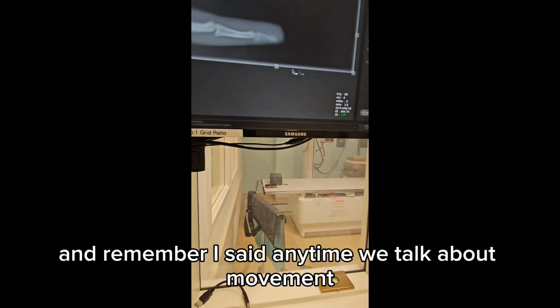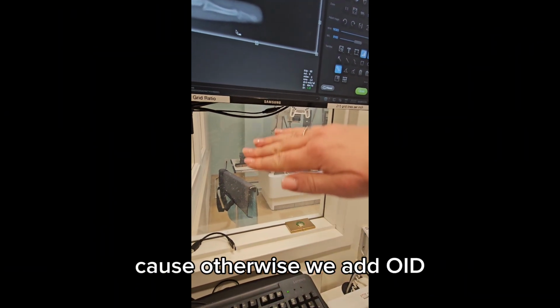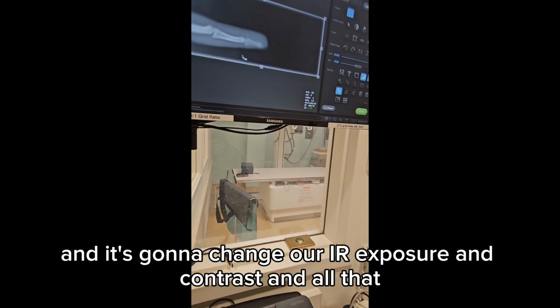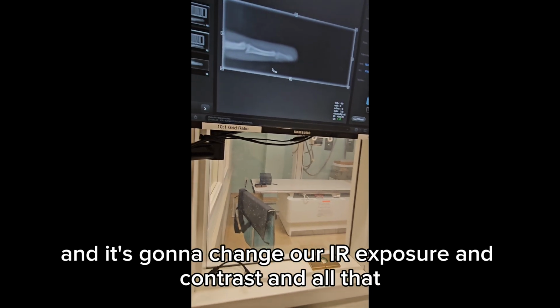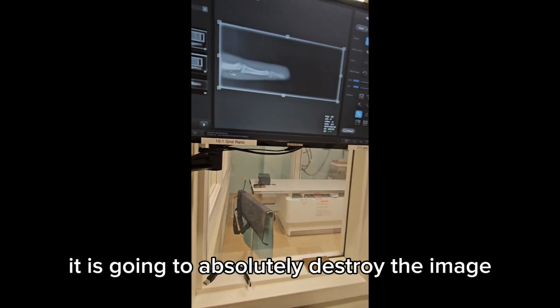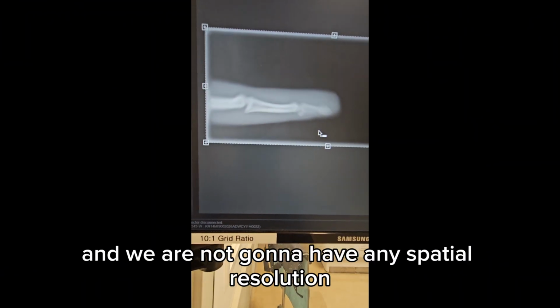And remember I said, anytime we talk about movement, we're going to talk about that lateral motion, because otherwise we add OID, which is going to change our distortion, and it's going to change our IR exposure and contrast and all that. But if we just have lateral movement, right, it is going to absolutely destroy the image, and we are not going to have any spatial resolution.